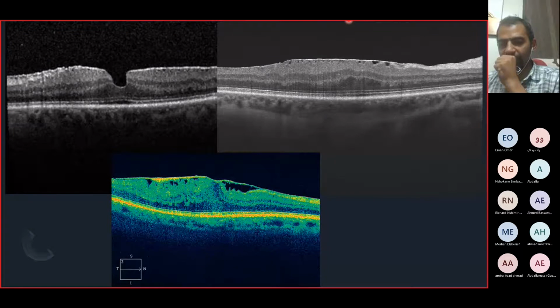Again, this one is called an epiretinal membrane, and it may cause traction on the surface of the retina with spongiform edema, and we call it vitreomacular traction. Or sometimes it is just adherent to the retina without traction, and we call it vitreoretinal adhesion. This is an important new classification of the vitreoretinal interface working group. They classified the abnormalities of the vitreoretinal interface.